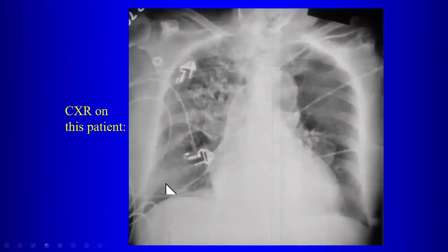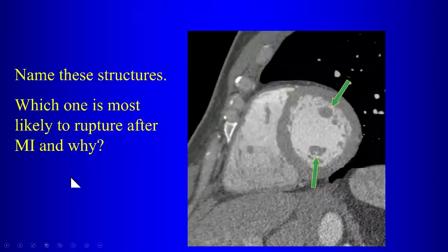mitral regurgitation. And then the chest radiograph, often in these cases, might show asymmetric pulmonary edema, especially worse on the right side, especially more severe in the right upper lobe, because the jet of the mitral regurgitation can be directed towards the right upper lobe pulmonary vein. And so that then can cause this asymmetric pulmonary edema, especially consolidation like that in the right upper lobe.